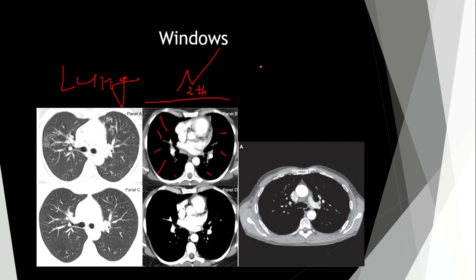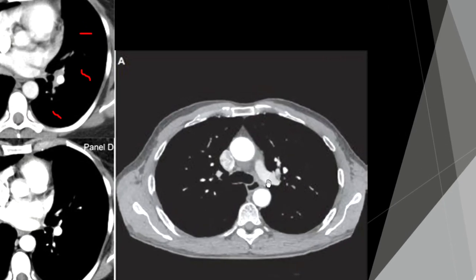And what does the third window that I want to show you mean? Look at every detail here and try to predict. Look precisely.